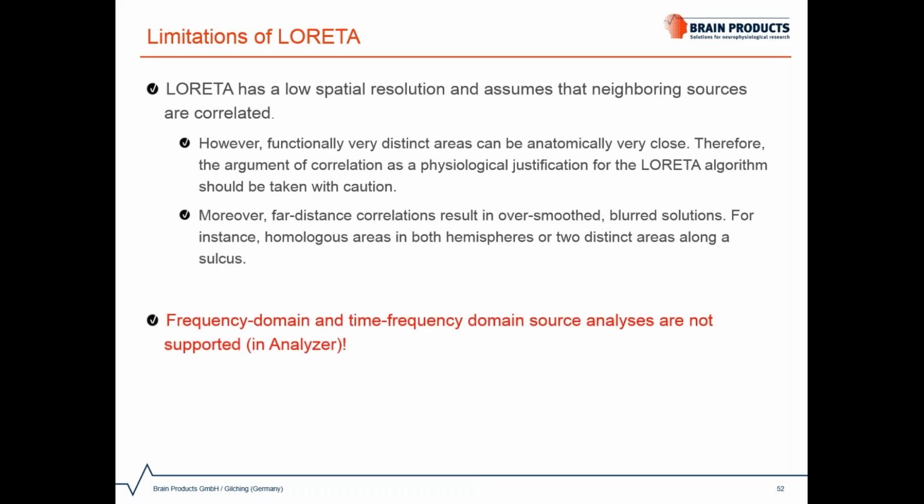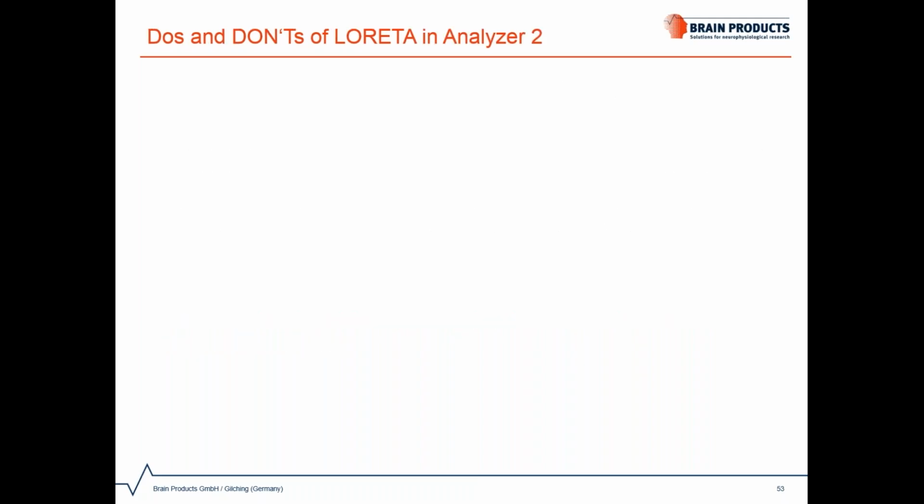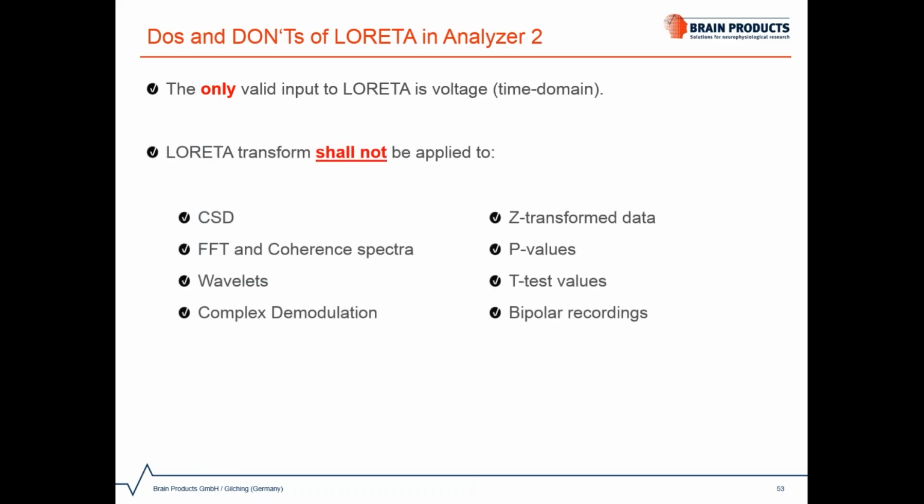The other limitation, which is specific to Analyzer, is that frequency domain and time frequency domain source analysis are not supported. This leads me to inform you the do's and don'ts of LORETA in Analyzer. The only valid input is a voltage value, that is, time domain EEG data. The outputs from frequency domain and time frequency domain data analysis, or the outputs from any statistical analysis, shall not be used as an input to LORETA.